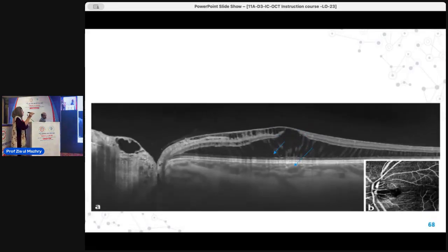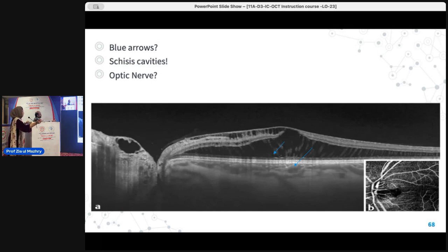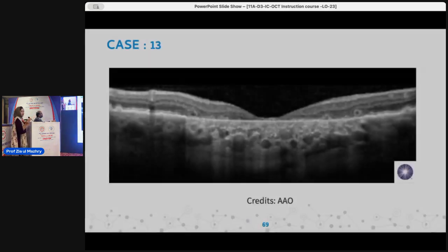तो ये OCT करवाया था पेशेंट का, तो अब OCT पे can anybody explain the findings? Again we are seeing here, this is the schisis of the inner layer and this is schisis over here of the outer layer. और यहाँ पे देखिए, अगर आप ऑप्टिक नर्व को देखें तो there is a pit over here that has been excellently documented on this OCT. So this is a case of optic disc pit. जो पिछली इमेज थी वो इस ये उसका OCT है, optic disc pit maculopathy.